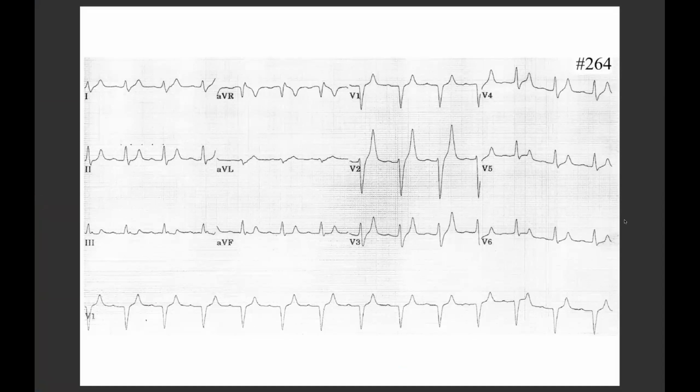Right. So first of all, I would say this is rhythmic. If I point out this QRS interval, it's quite rhythmic, and in every other lead it's the same. The heart rate, I would say, is 85 BPM.